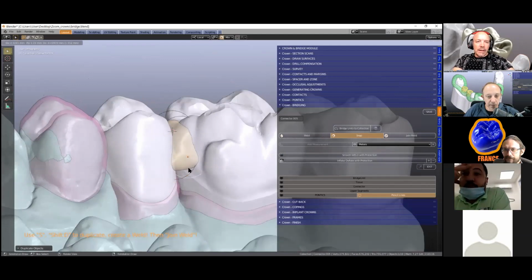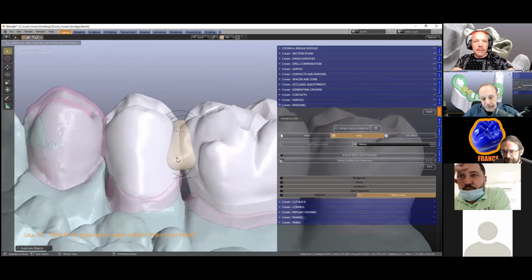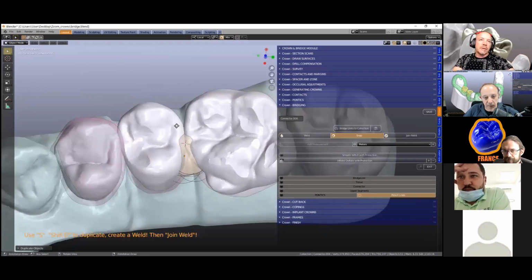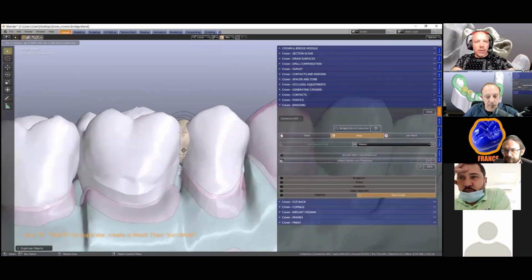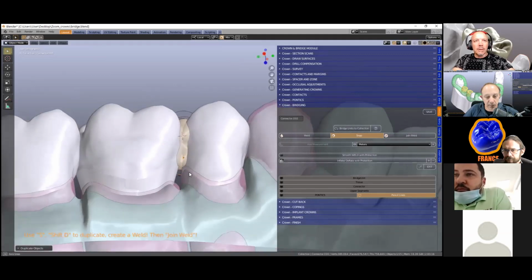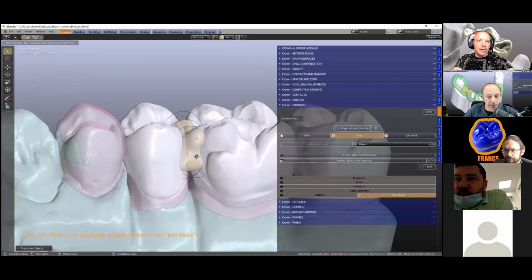So we can decide where we want to put these little blobs. Okay, so I'm going to take this and extend it. Basically we want to put it all the way around our model. Then I'm going to go to the other side. If you wanted to strengthen it as well, we can strengthen it. So there's a lot we can do.